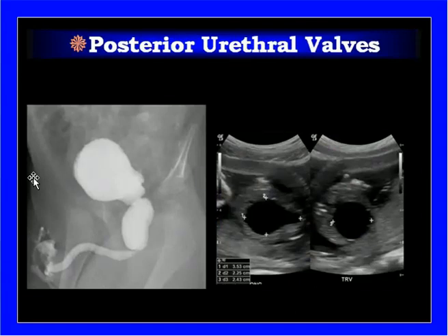Posterior urethral valves exclusively present in the male child. They can be seen when the baby is inside the uterus, and the picture is mostly moderately or grossly dilated urinary bladder, moderately dilated ureters, and bilateral moderate to gross hydronephrosis.